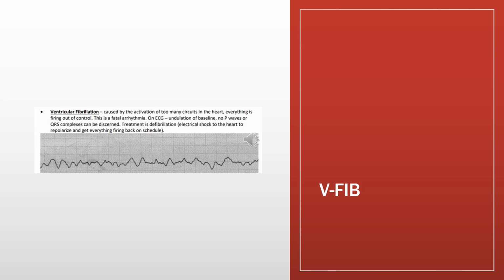I will say that this isn't something that you see often, neither is pulseless VTach. There are a handful of times I've actually seen a defibrillator used at all, but these are rhythms that you need to be aware of and be able to identify quickly, because if they are true, then that animal needs to be defibrillated immediately or they may not be resuscitated.